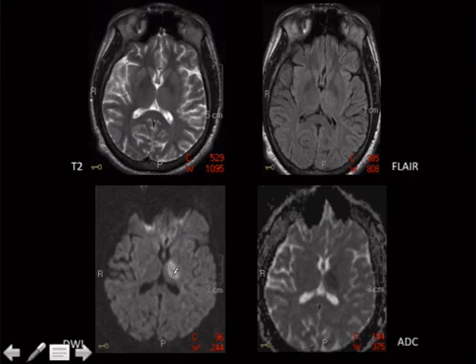So what I'm showing here is that there is indeed an area of restricted diffusion. Not everything that restricts diffusion is a stroke. Remember, lots of other stuff can do that. Certain infections, CJD can cause a gyriform restricted diffusion. Herpes can restrict diffusion. Bacterial abscess can restrict diffusion. Atypical infections sometimes don't. That's worth knowing. Hypercellular tumors restrict diffusion. Classic one is lymphoma, but it can also be medulloblastoma or GBMs. Hematomas can restrict diffusion.